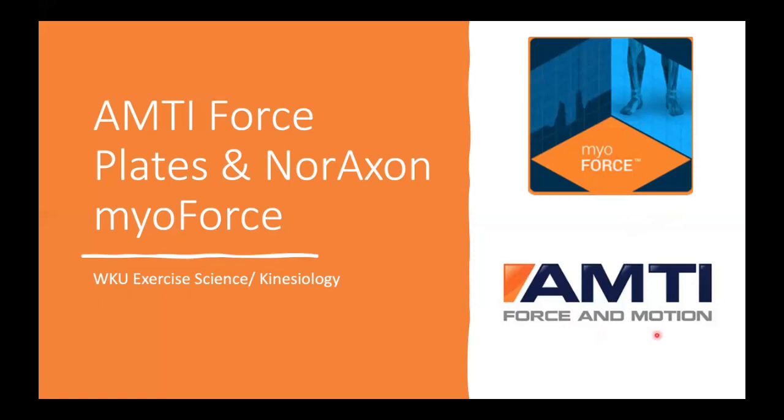But the AMTI is on a computer that doesn't have internet access, so I wasn't able to get on and record from the actual software. So I had to take some screenshots, and you just have to bear with me for the initial portion of the lecture. I still feel that it will facilitate a good idea on how to use the AMTI force plates, though. Again, the force plates can do a number of different things, but this lecture is going to be focused on just interpreting countermovement jump or vertical jump height.